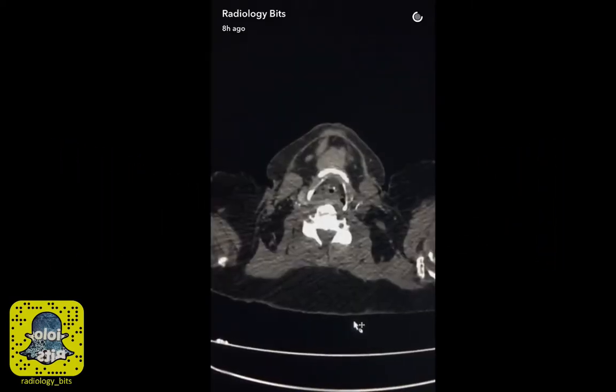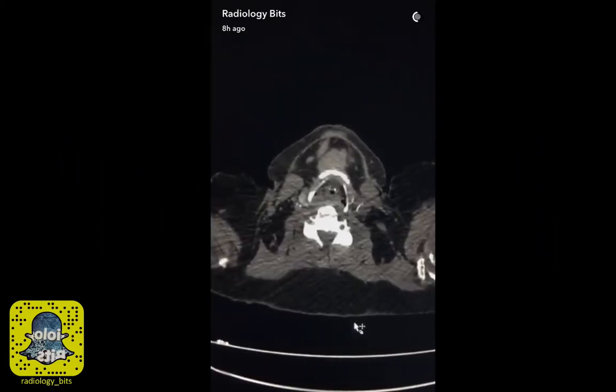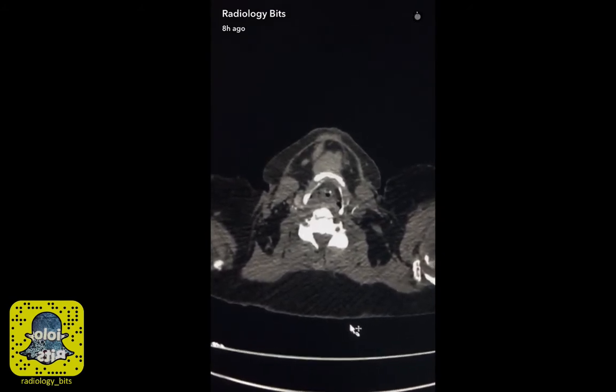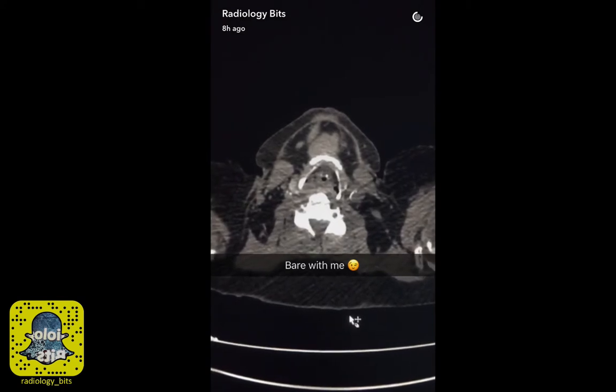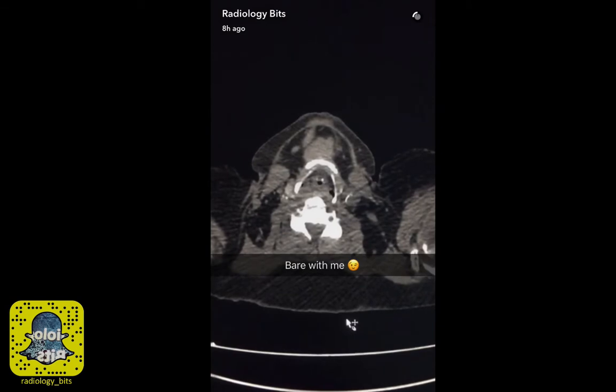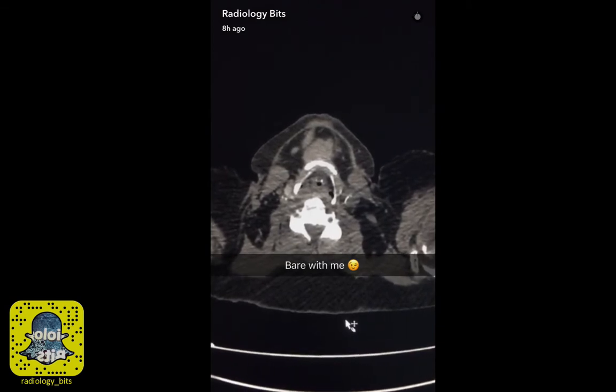Hi again. This is a case with a quick teaching point. I think this would be useful for both seniors and juniors. I'll just go quickly over a few basic things so juniors could follow. Seniors, you'll see something interesting at the end.